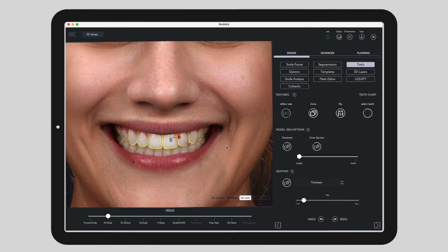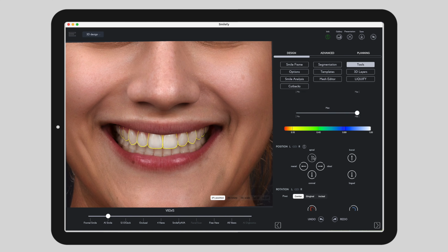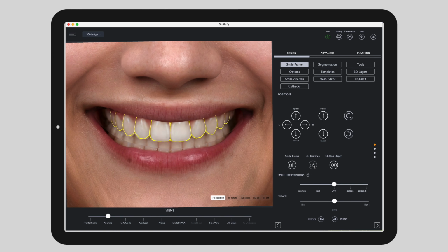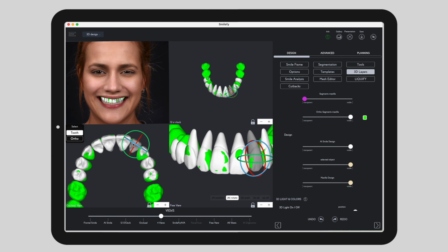Integrate the ortho plan with the smile design. Once the 3D templates are fully aligned with the AI smile design, you can begin fine-tuning the orthodontic plan to ensure it works seamlessly with your aesthetic goals. At this stage, both components come together. The orthodontic setup provides proper alignment, symmetry, and axial angulations. The AI smile design provides the aesthetic blueprint for tooth shape, length, proportions, and smile curve.